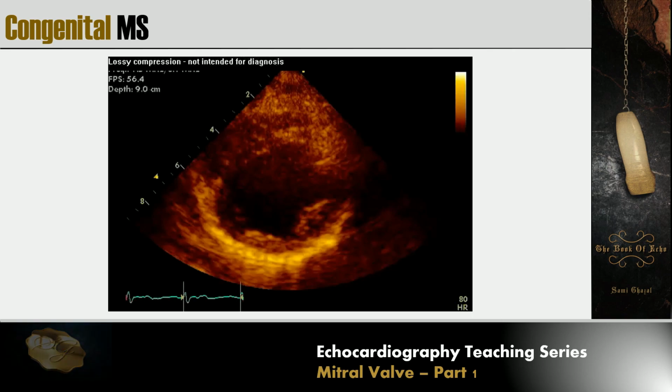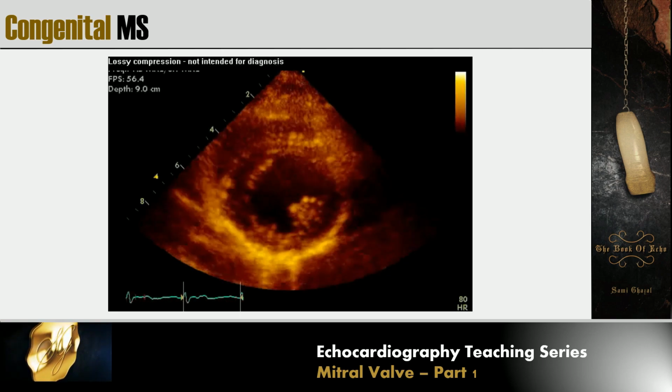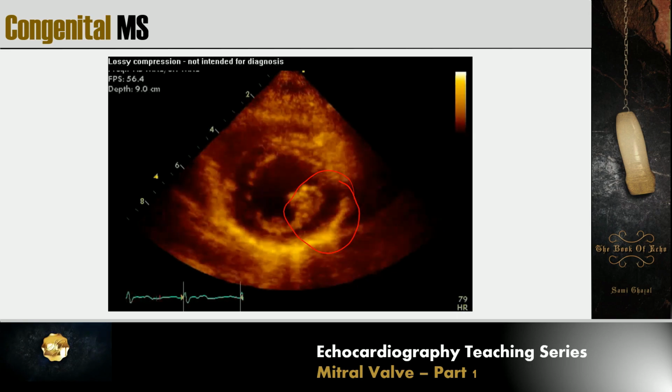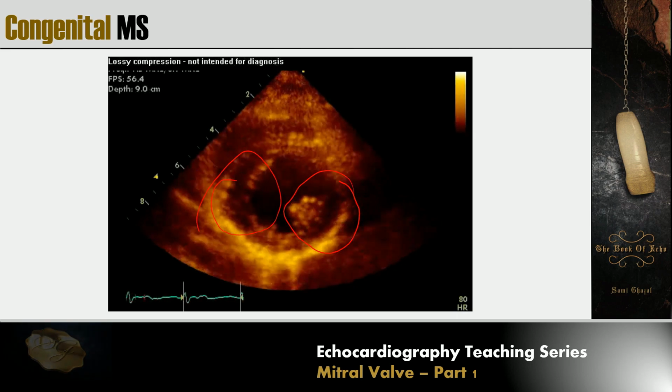And here we can see a short axis view of the mitral valve. As you can see, there is a single papillary muscle that can be demonstrated here, and here the papillary muscle is the anterolateral papillary muscle. We don't see any papillary muscle in the posteromedial position.